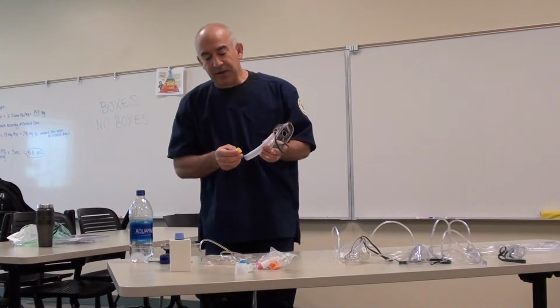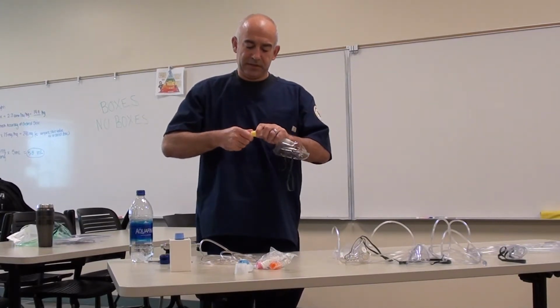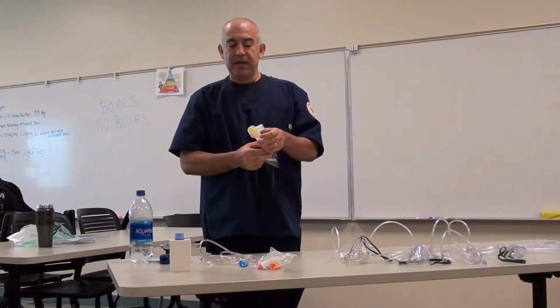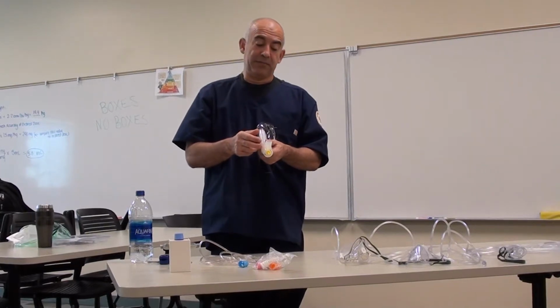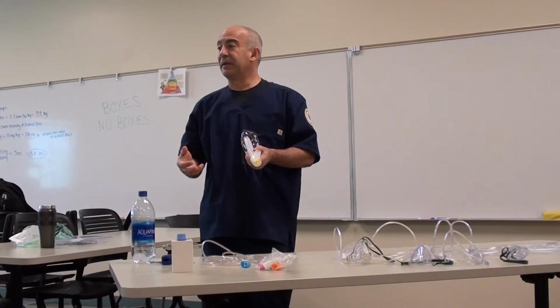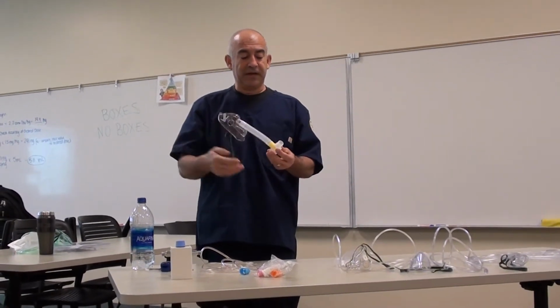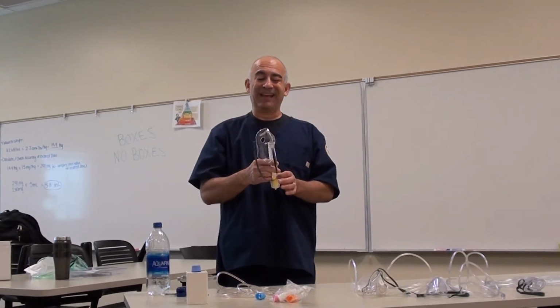In any case, what you would do is attach the jet intake to the mask and attach the collar around it. This collar is important because it protects the ports from being clogged by, let's say, a blanket or the person's arm or something, because it's super important that they get the amount of outside airflow to mix with the supplemental oxygen coming through there to deliver the precise FiO2.